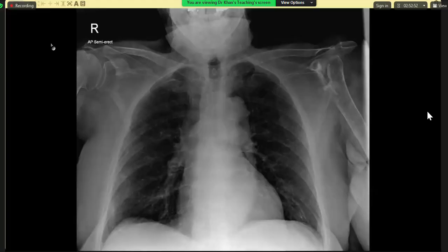As far as surgery is concerned, there is no history of surgery. The patient has got shoulder pain, and it is actually a bilateral finding, clinically speaking. Do you see anything on the right side? On the right side, there is some superior subluxation.